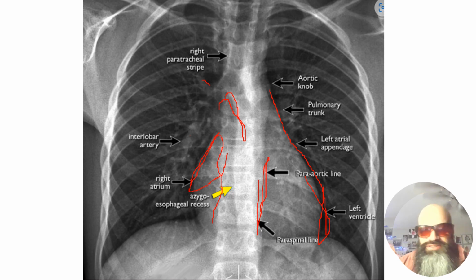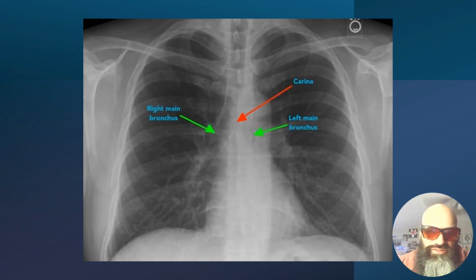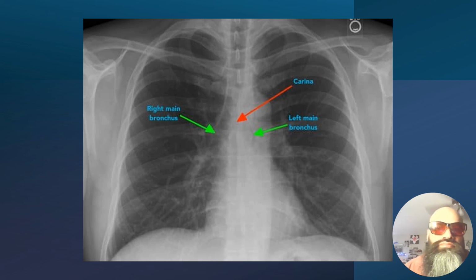Now we discuss the densities quite often in class with air, water, bone, and metal. Please keep these densities in mind when you are evaluating your chest x-rays, as a thorough understanding of the different types of densities will help guide you in determining pathology on chest x-ray.